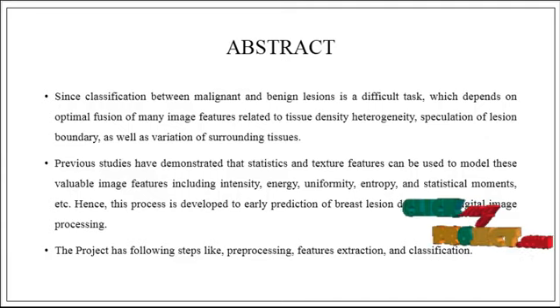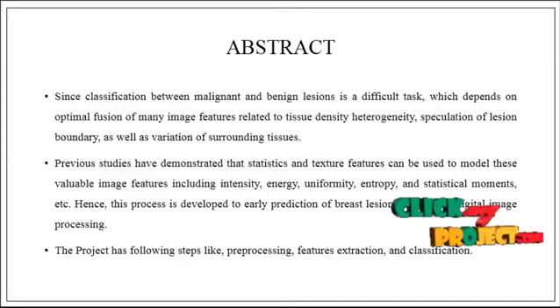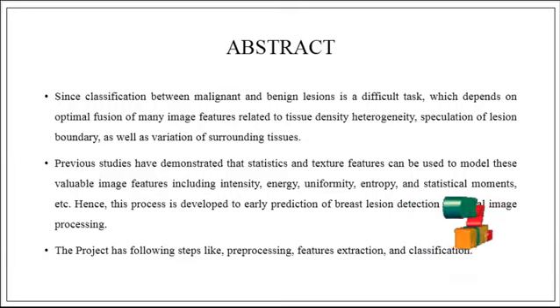Hence this project follows the steps of preprocessing, feature extraction, and classification. By using these three steps, we have designed the project to classify whether the breast region has lesions or not. If it has a lesion, we can find out whether the lesion is benign or malignant.